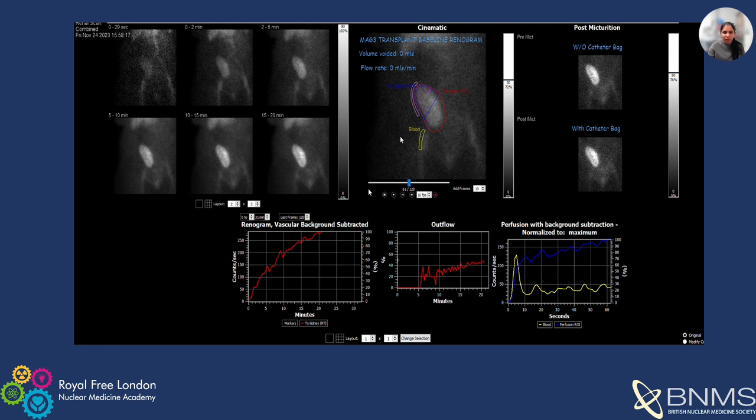The finding in this case was that the right iliac fossa transplant kidney appears well perfused, with no focal peripheral cortical defects to suggest an infarct. There is uniform selective tracer uptake but impaired tubular secretion with a slowly rising time activity curve.